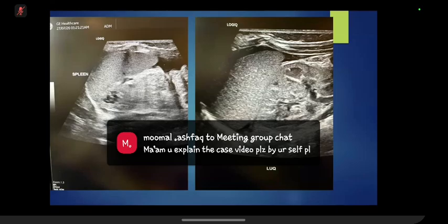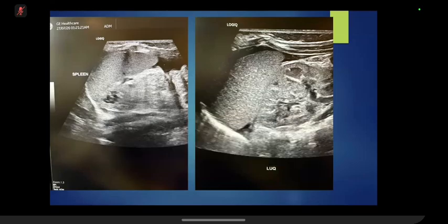When he did the ultrasound, he was sure that there is some turbidity of the ascites, like here you can see, perisplenic, and that poses a relative contraindication to proceed for the intussusception reduction. So he didn't do that, but the patient did get to some other hospital, and it's also linked with our hospital. So we did have a record that somebody tried to perform it there. But when they did perform, they were not successful.